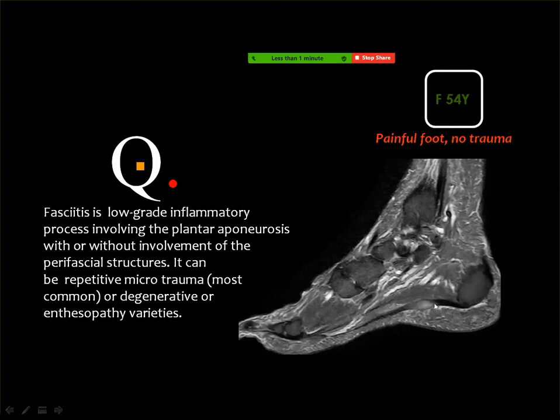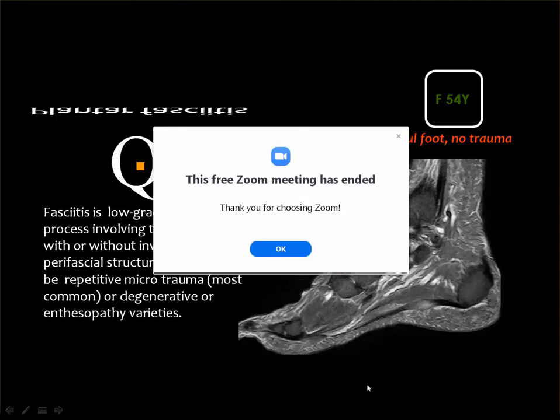What is the name of this structure? Plantar fibrosis. No, this is just plantar fasciitis. With plantar fibromatosis you get a mass, but here you got just thickening of the plantar fascia with abnormal signal in the T2-weighted image, which is diagnostic of plantar fasciitis.